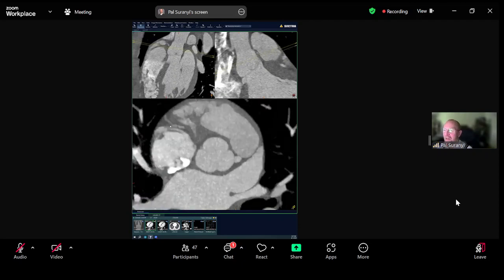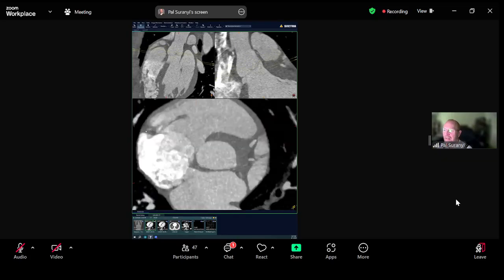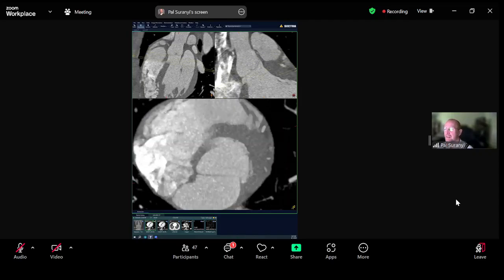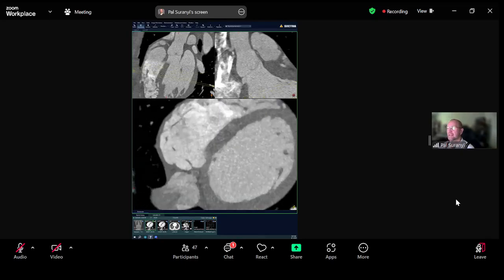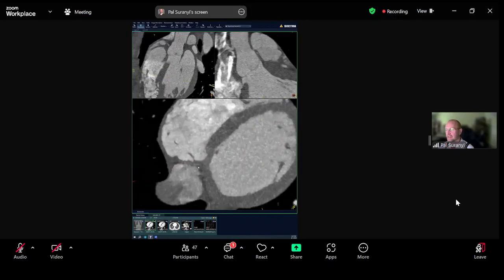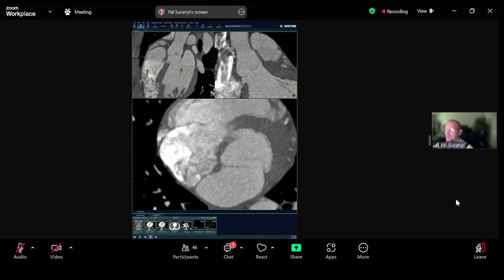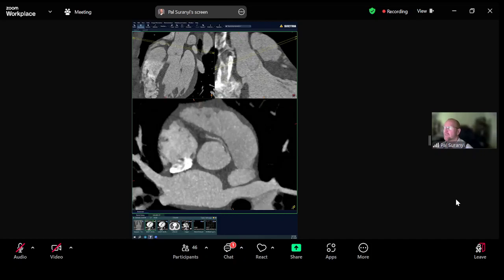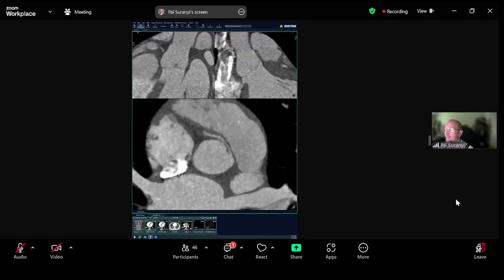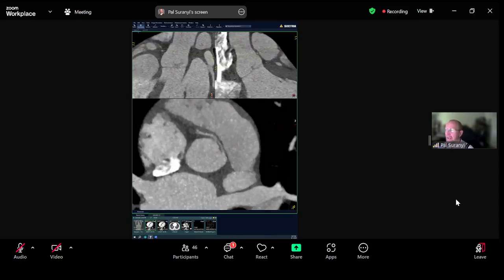If we follow this right coronary artery, we see a nice acute marginal branch there, with a little bit of motion here and there, but we're going to follow this vessel down. Distally we can also see, faintly, that this is probably a dominant right coronary artery. I'm going to come back to it once more. What I think is super helpful when describing these coronary anomalies is to go in the center of the aortic root or the aorta, and try to rotate.